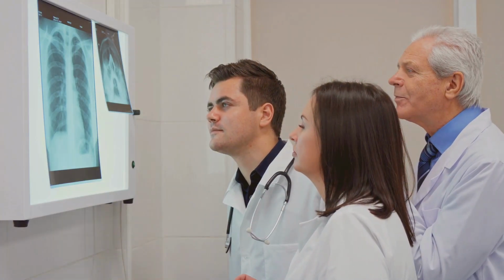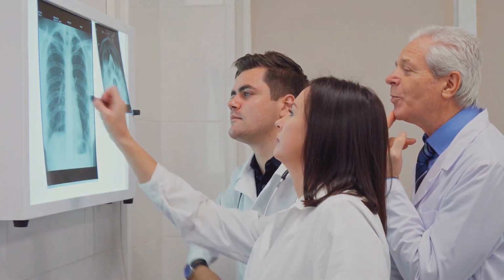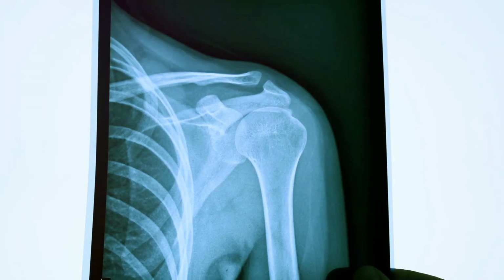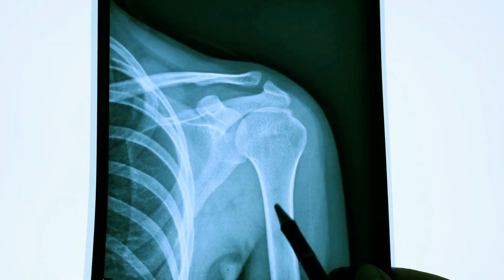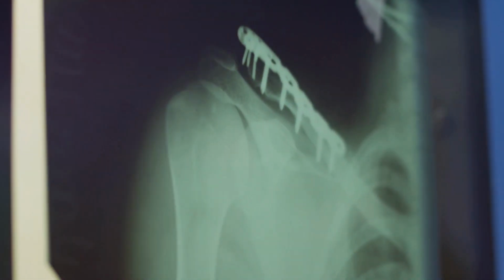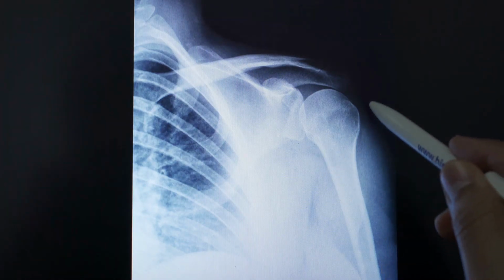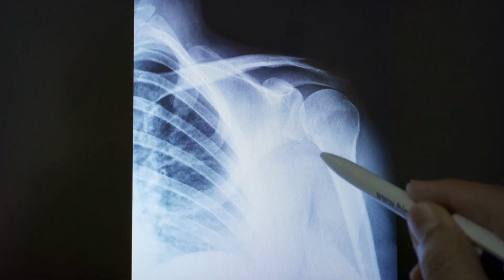Understanding how to properly obtain and interpret shoulder X-rays is essential for medical students, as it forms a fundamental part of their training. This guide will provide a comprehensive overview of shoulder X-rays, ensuring that students and practitioners alike can master this important diagnostic tool. We will cover basic anatomy, standard views, image interpretation, common findings, potential pitfalls, and tips for success, making sure you have all the necessary knowledge.